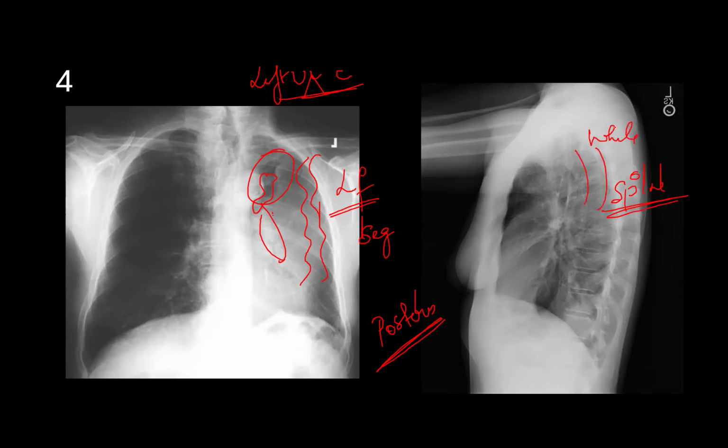Okay, we'll not be able to see. But as it passes down, in general, if I want to say, it will become more black because rays will pass directly. But here, because of the collapsed lung, the rays won't pass. Hence, this will appear white. Here you can see, no, it is white compared to the upper vertebra. So this is the spine sign.